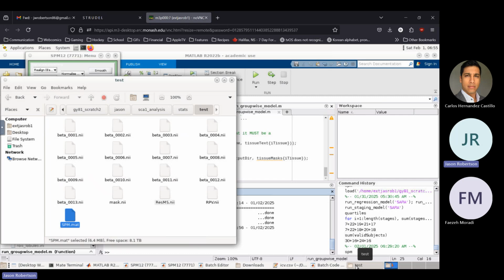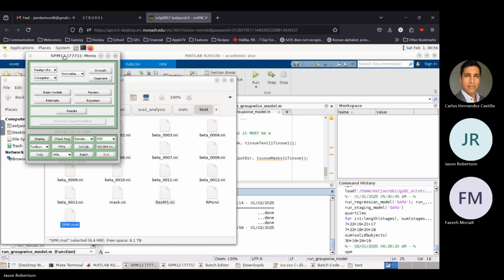Well, it has finished. Okay. It didn't take that long. I was expecting it to be much longer, but I think I got used to SCA 3 where there's 3 times as many subjects.